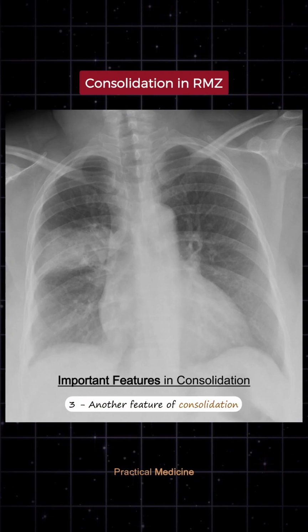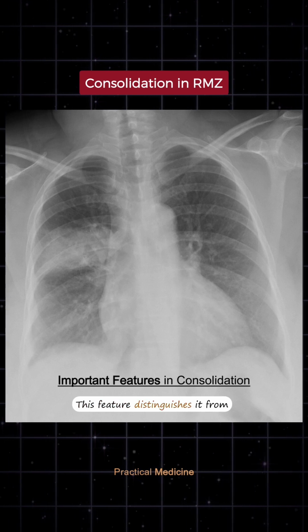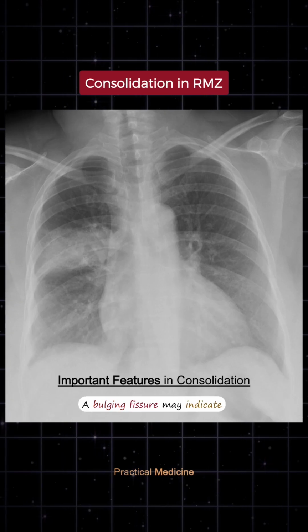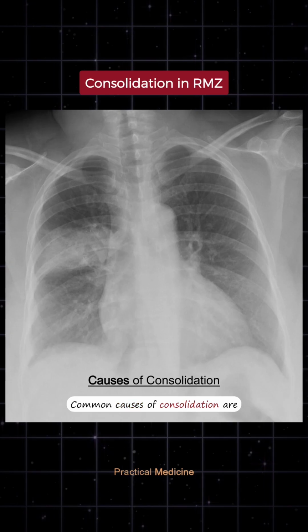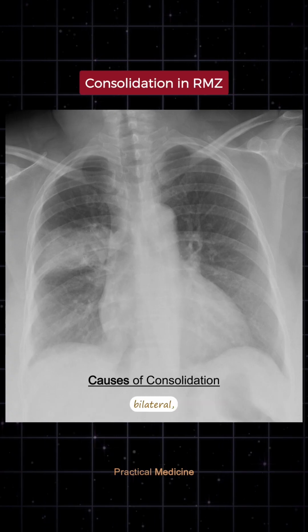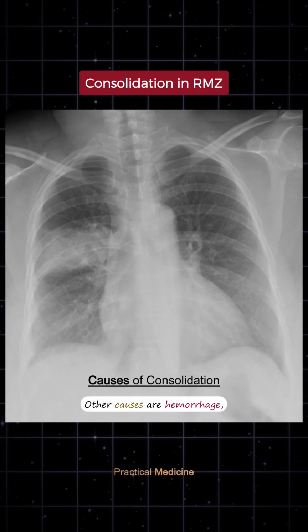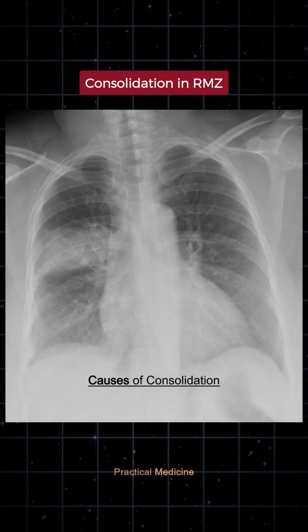Another feature of consolidation is that there is no or minimal volume loss. This feature distinguishes it from atelectasis. A bulging fissure may indicate expansion. Common causes of consolidation are pneumonia, which can be lobar or segmental. Pulmonary edema, which is bilateral, gives a batwing appearance. Other causes are hemorrhage, infarction, and organizing pneumonia.